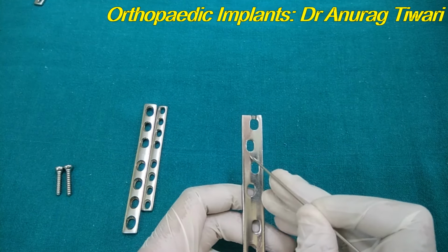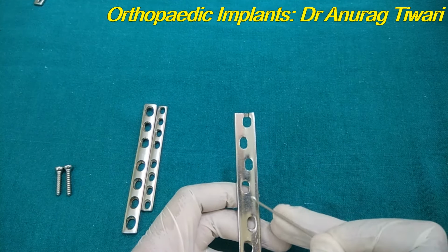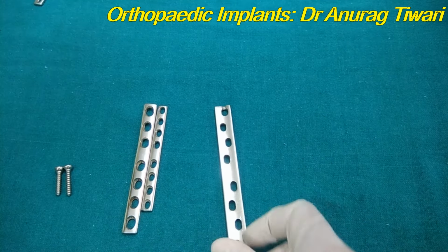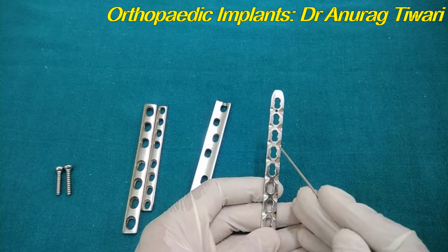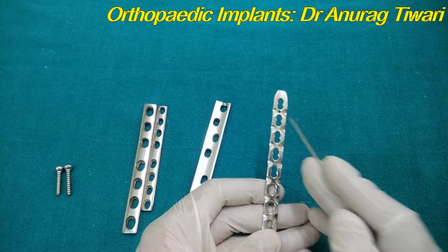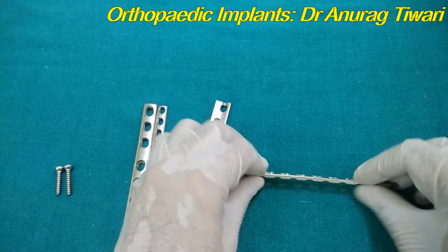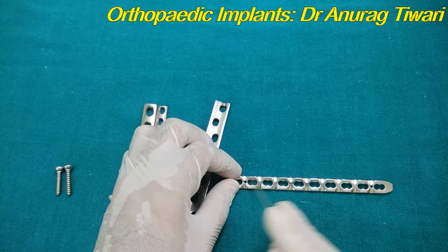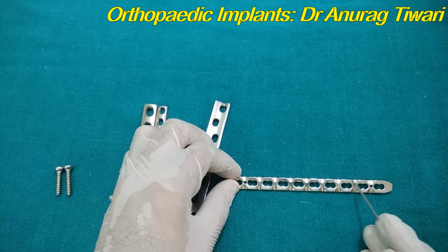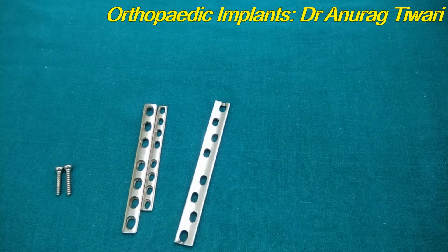The empty or vacant spaces in between the screws, they have created grooves like you see in this plate. Grooves are made so that when it gets over the bone, this much of the periosteum will be preserved. It will not get compressed. So this is the basic idea of making the LC-DCP, or low contact DCP.